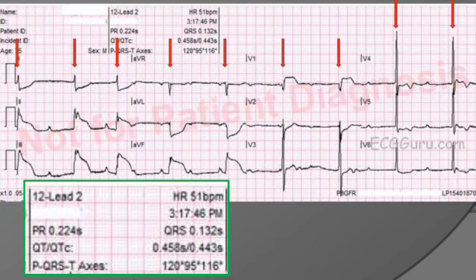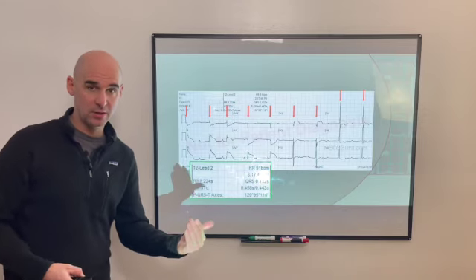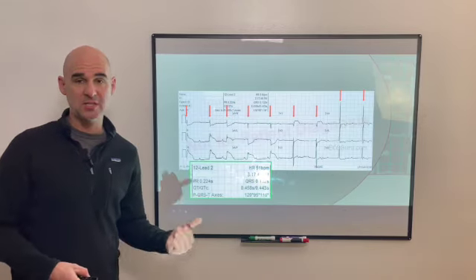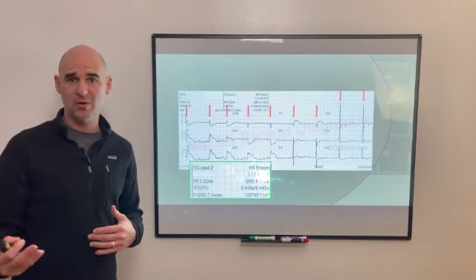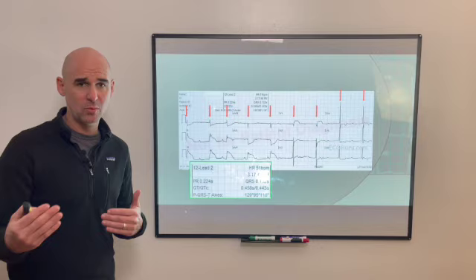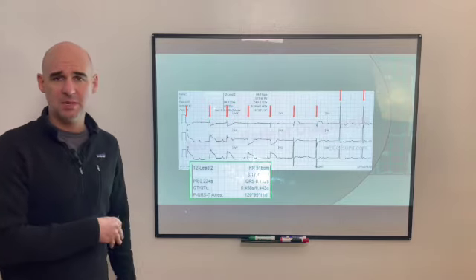And in this case, if we march things out, we're going to see that this is actually an irregular rhythm, right? So we have a slow rate, it's irregular, and looking at this, this patient's actually in a third-degree heart block. So that's hugely important for us to determine early on in this patient, rather than just going, yeah, this patient's having a STEMI, let's immediately start doing the STEMI care.